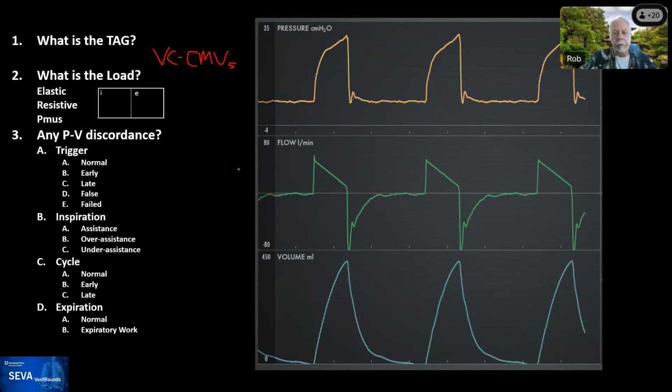Okay, so now having given us the tag, what do you think the load is for inspiration and for expiration?